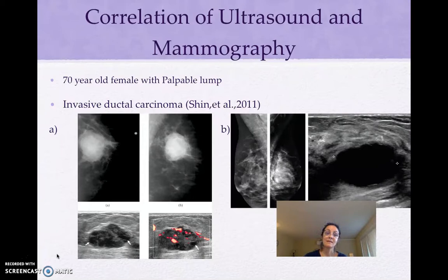And then they sent that patient to do the biopsy, and mostly biopsy is ultrasound guided. So they guide the needle with the ultrasound to exactly sample the mass at the right location. And the result of the biopsy came out invasive ductal carcinoma, which is malignant.